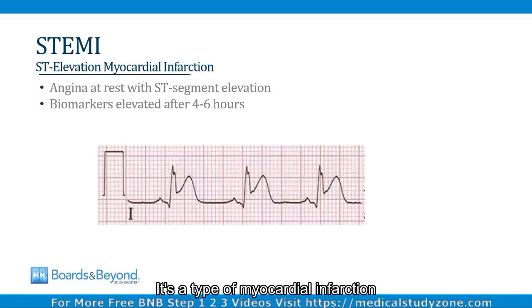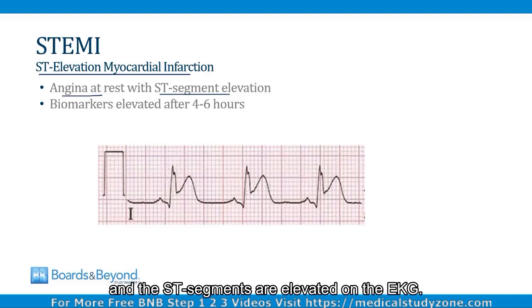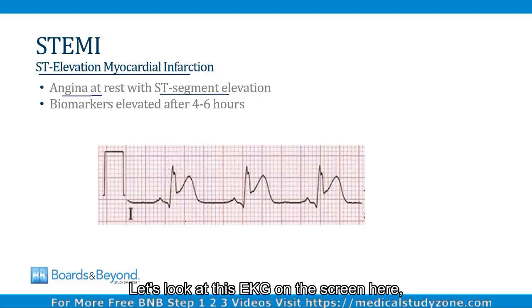STEMI stands for ST elevation myocardial infarction. It's a type of myocardial infarction where patients have angina at rest and the ST segments are elevated on the EKG. Let's look at this EKG on the screen here.